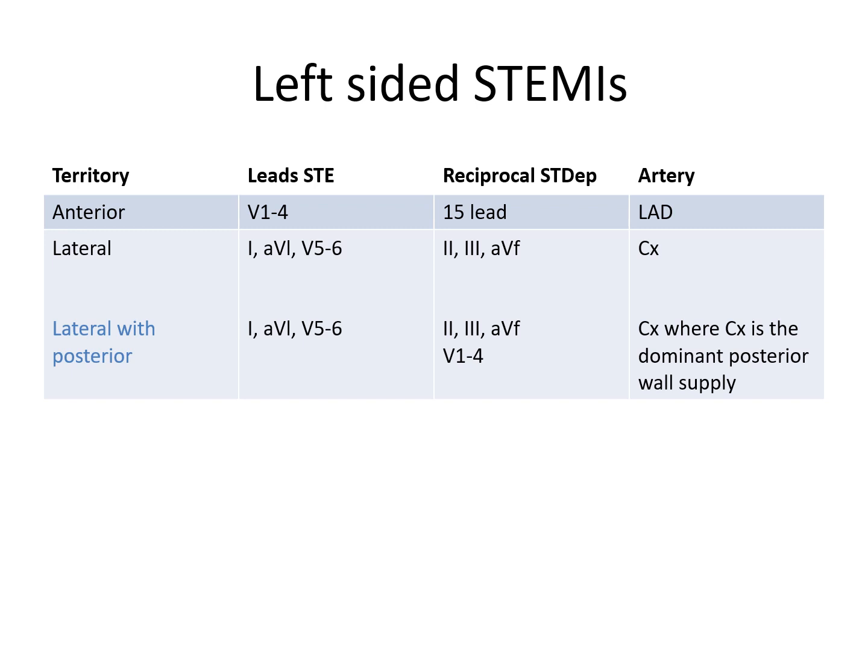So again, we'll have all the signs of the lateral MI. We'll have the ST elevations in the lateral leads, reciprocal ST depressions in the inferior leads. But on top of that, we'll have ST elevations in the posterior leads, which again, we don't routinely do. So what we'll see is the mirror image ST depressions anteriorly in the leads V1 to V4.